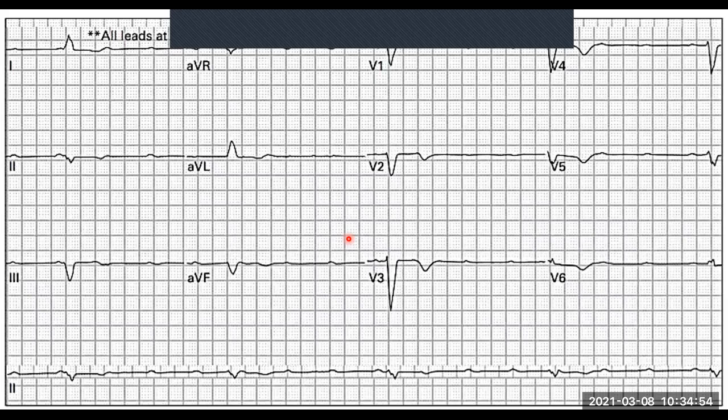The most important thing now is that we've got the ECG in front of us. The first thing that we notice is we've got a very slow heart rate, even though it's not the place to begin, but it's the first thing that strikes you out of nowhere. We've got 1, 2, 3, 4, 5, 6, 7, 8, 9, 10, 11, 12 blocks between R complexes or S complexes or Q waves. So we've got a rate of about 25. So this is an extreme bradycardia.